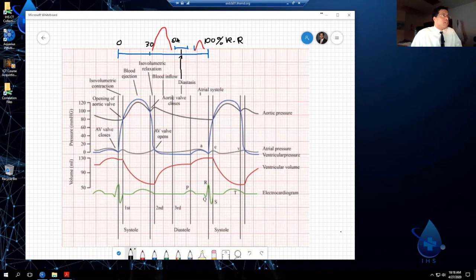If you told me I could have a few more, I would pick 60 through 80. Okay? 60 through 80. I'm drawing it with a mouse, guys. Don't make fun of me. Now, that's why there's a lot of motion in early passive filling from 30 through 60. There's a lot of motion from 90 to 100.